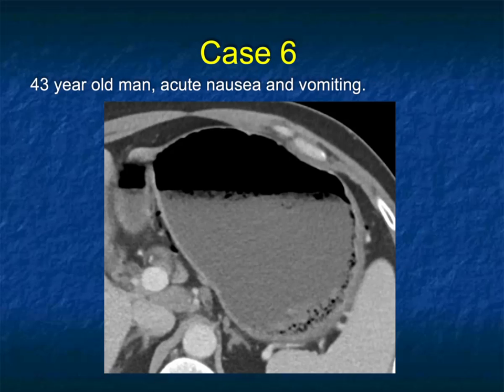Another case. What do you see here? Well, at first glance, you see fluid layering out of the stomach, but then you look at the posterior aspect of the stomach and you say, what exactly is going on over here?